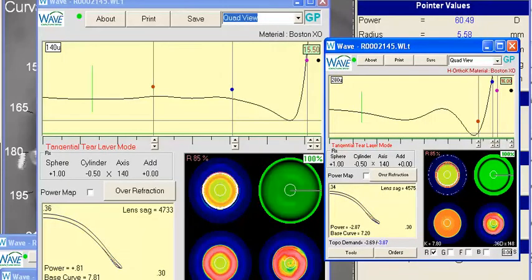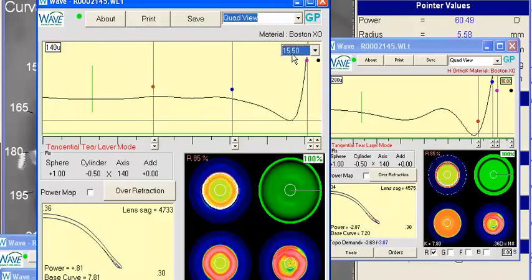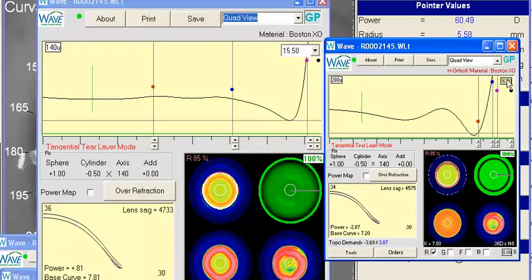Okay, welcome back. Now you see once this lens has been designed, if we go back to your original design, you have a little bit of a steep edge angle over here. It doesn't want to come up. But if we go to this newer one, you'll see that we have a much flatter edge angle. So I think that'll help you out with that peripheral lift area.